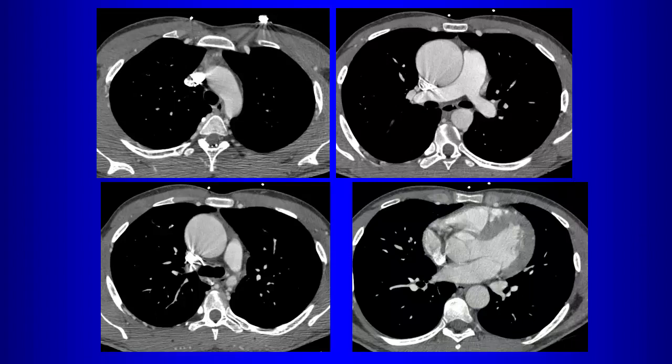Aortic coarctation. Do you see it? You don't see the aortic coarctation? How about you look harder? Oh, yeah, on the lower left. Look at the descending aorta. Here, what happens here? So aortic coarctation on your axial views can be extremely sneaky. You can easily miss it on your axial views.